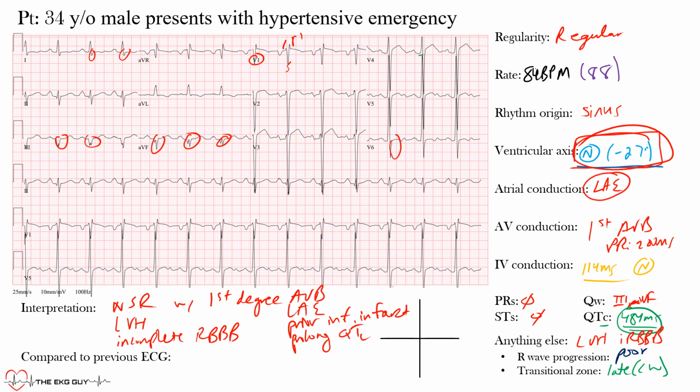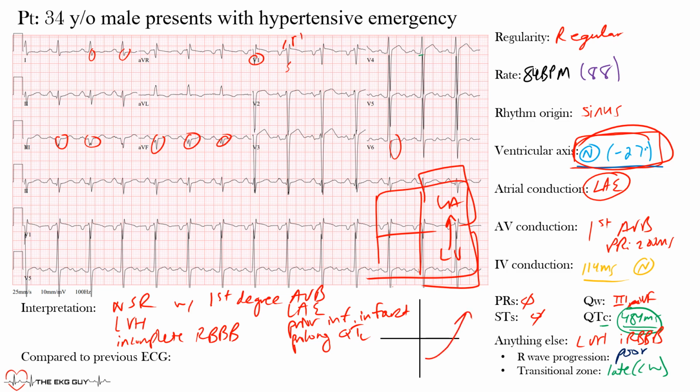And the left atrial enlargement, very significant here, likely because of the left ventricular pressures. If you imagine, here's your left ventricle pushing back on your left atrium, enlarging that, causing the strain, and that's why you see the shift more leftward. And you have the inferior portion of the heart not working well, so the force is again pushed leftward. So a lot going on here.